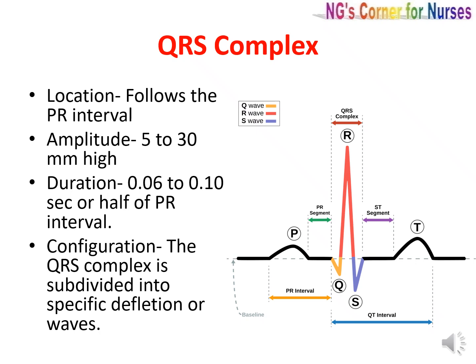There may be abnormalities in QRS complex. The pathological Q wave or the deep wide Q wave may indicate myocardial infarction. Notched R wave indicates bundle branch block, and missing QRS complex indicates AV block or ventricular standstill.